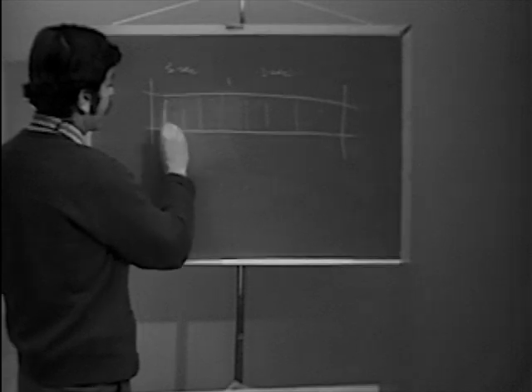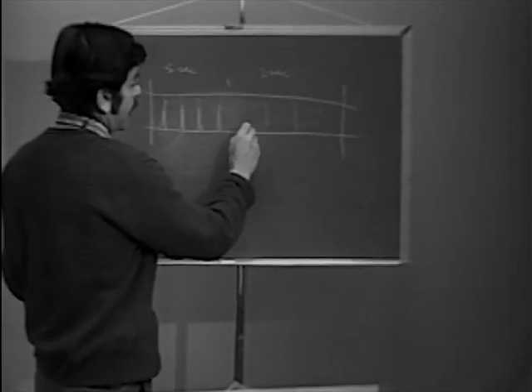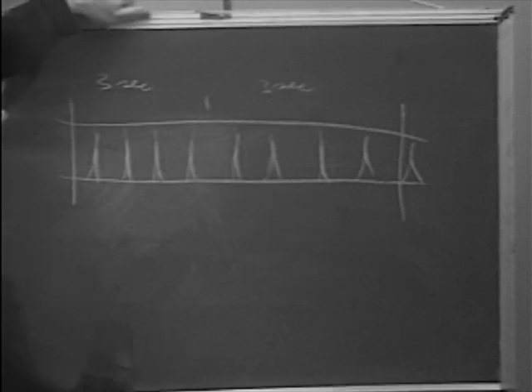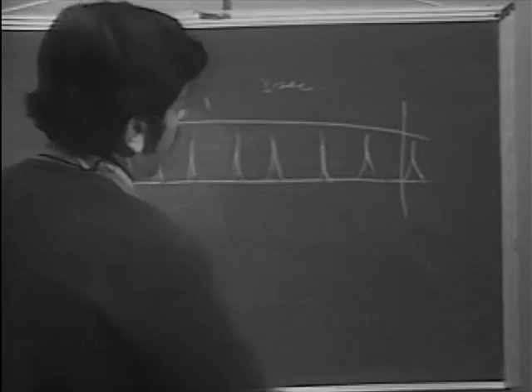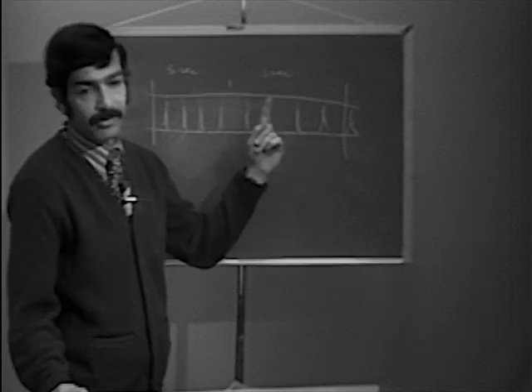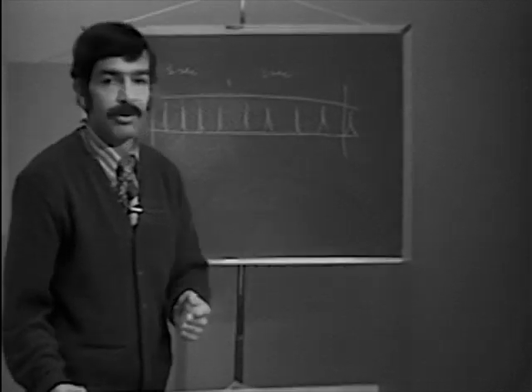So let's say, for instance, this is where I've drawn some QRS complexes, right? Now let's count these. 1, 2, 3, 4, 5, 6, 7, 8, almost 9. So this heart rate then would be 90. So what you do is you count the number of beats in a 6-second strip and just add a 0 on the end of it.